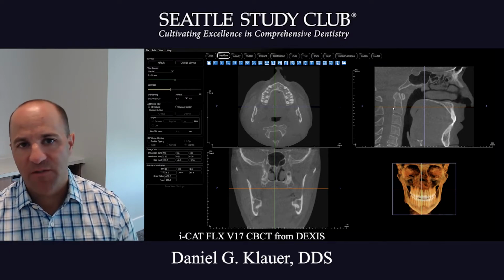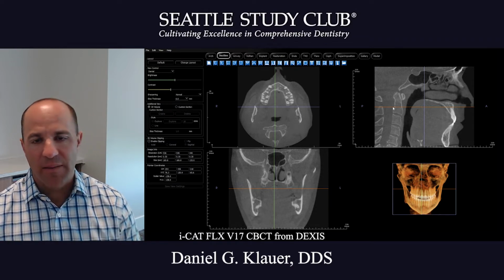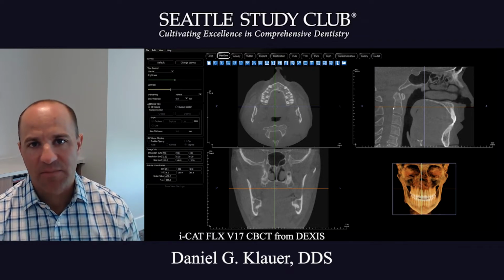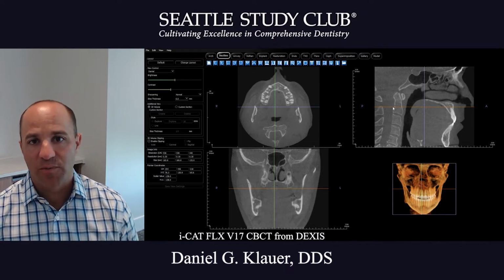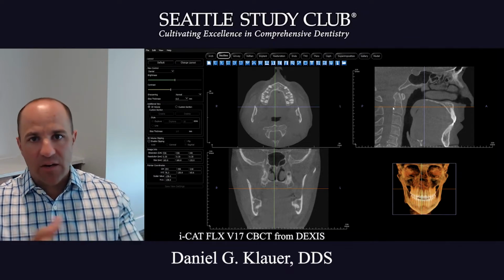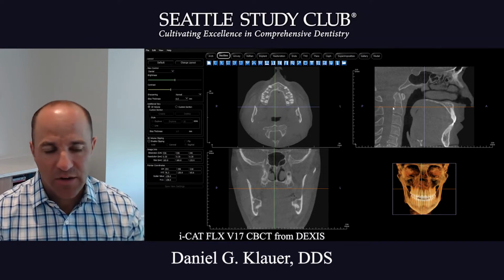So my specialty is focused on treating patients with craniofacial pain, headaches, migraines, snoring, and sleep apnea. And so my expert tip today is going to be talking about cone beam scans, looking at those and getting comfortable reading them. So I'm going to quickly go through what I look at and how I got comfortable doing that and show you a thing or two.